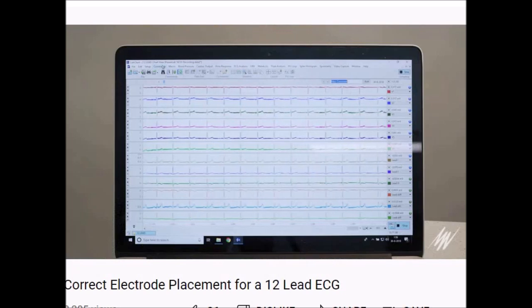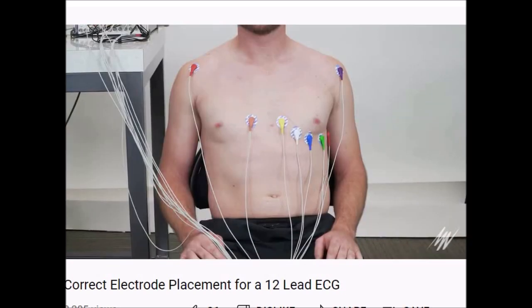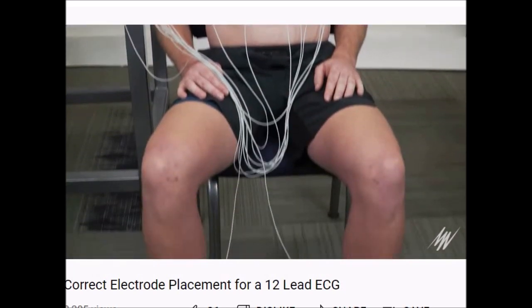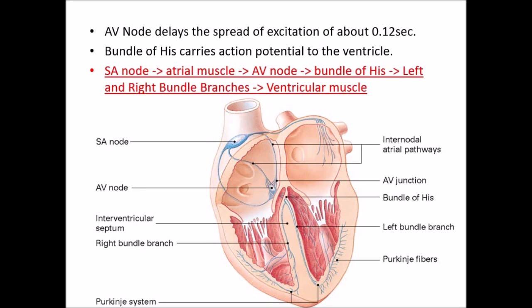An important part of getting really clean ECG data is to have the subject either lying down or sitting very relaxed in a chair, as EMG can interfere. So that's all for today's video, and in the next class we will see similar animations for EEG. Okay, thank you.